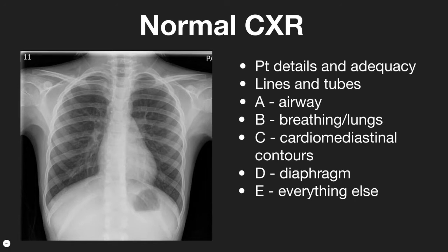This kind of pattern is most useful for the seemingly normal X-ray. Ultimately, when you get more experienced, it's not this clear-cut, and you'll be assessing these components in a more pragmatic order. For example, it makes sense to talk about B before A in context of a large pneumothorax or whiteout. In an exam setting, if a chest x-ray is obviously abnormal, you should address the abnormality. An examiner is not going to be particularly impressed if you keep avoiding talking about an obvious abnormality for the sake of going through the pattern in order. But once the main abnormality is described, go back to the pattern so you do not miss a second abnormality.